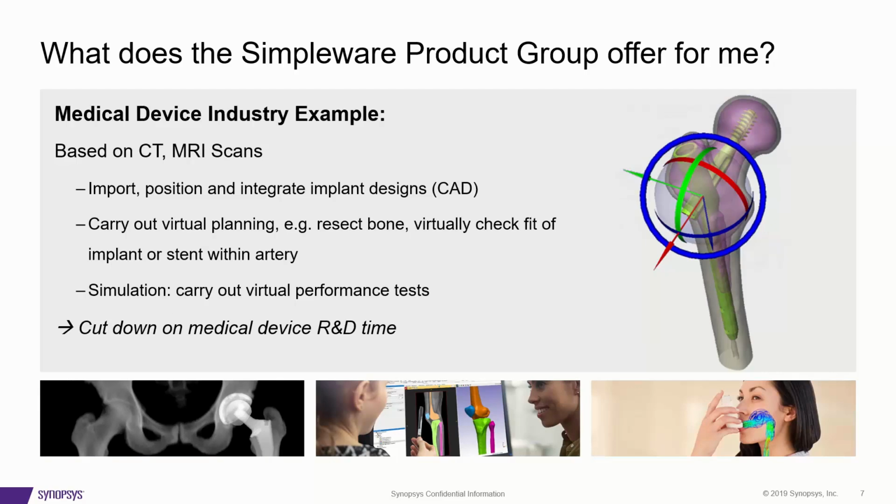If we're looking at how our software can be used within the medical device industry, really, if you're looking at orthopedic instruments or even devices and implants, then our software can be used to analyze how different designs are reacting with the human body or the expected anatomy within the patient. So with our software, we can go through the segmentation steps and produce the models of the patient, or this could perhaps be an average percentile and even a patient-specific case. So we can produce the patient-specific anatomy.